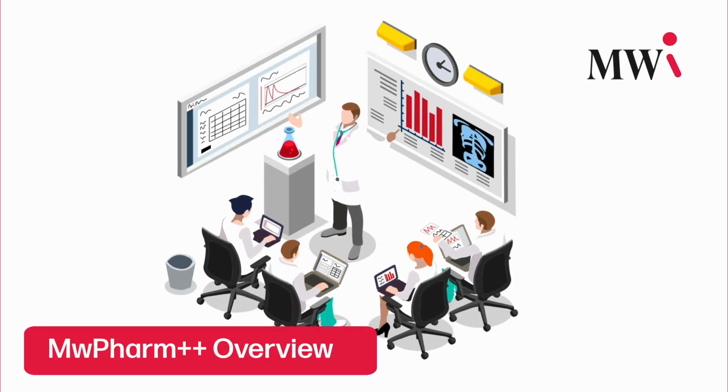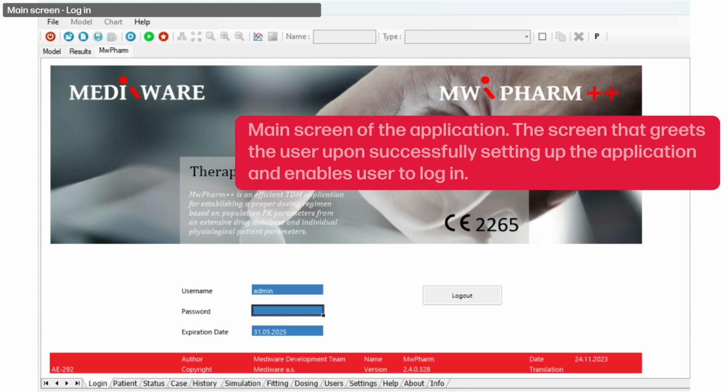MwPharm++ Overview. Main screen of the application. The screen that greets the user upon successfully setting up the application and enables the user to log in.